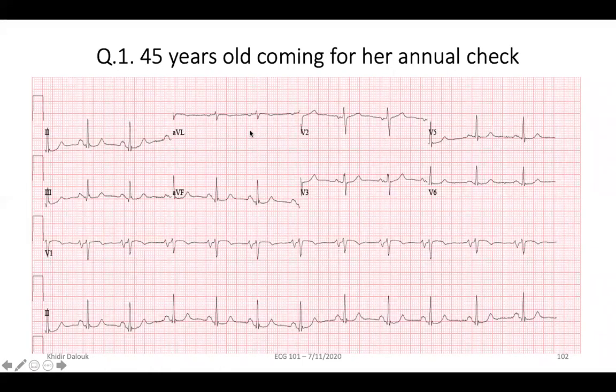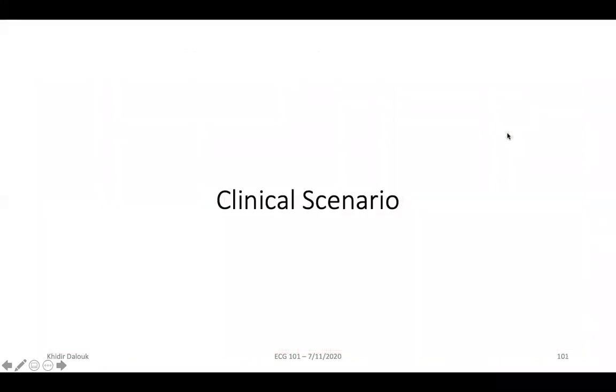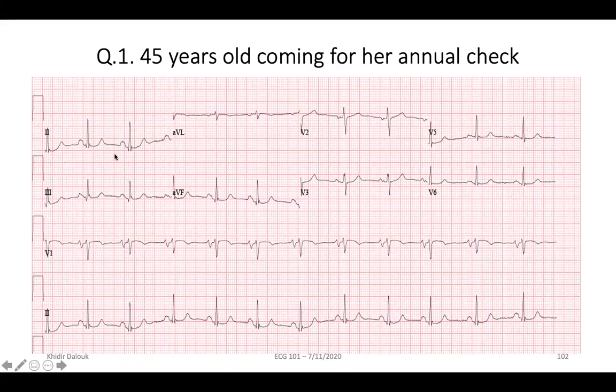And as I mentioned, to determine sinus rhythm, you have to look at the P wave morphology in the inferior leads, 2, 3, aVF, lead 1, and you look as well at V1. If it's upright in those leads, that means the activation wavefront is going from high in the atrium towards the inferior leads, and that's why you get a positive P wave. And it's biphasic in V1, as I explained before. It's initially going towards the right atrium, and then the activation wavefront goes all the way posteriorly to activate the left atrium, and that's why it's biphasic. So here, the rhythm is originating from the sinus node.